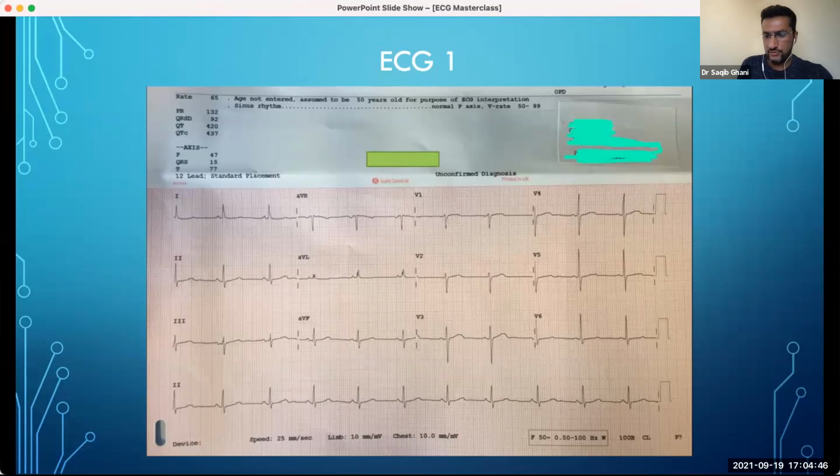No answers, I will assume it's normal, and I'm happy because this is normal. This is actually my ECG. So I'm glad everyone agrees it's normal. Okay, I'm now going to add some clinical information to it, because ECG on its own means nothing.